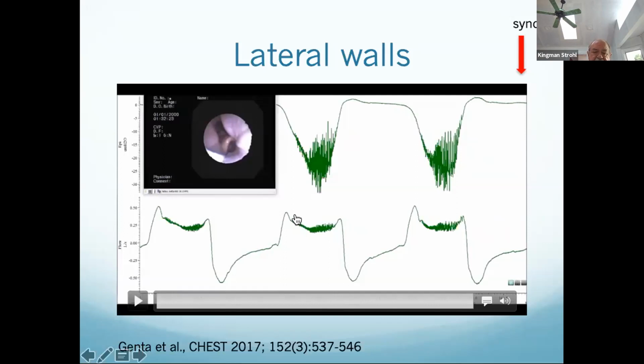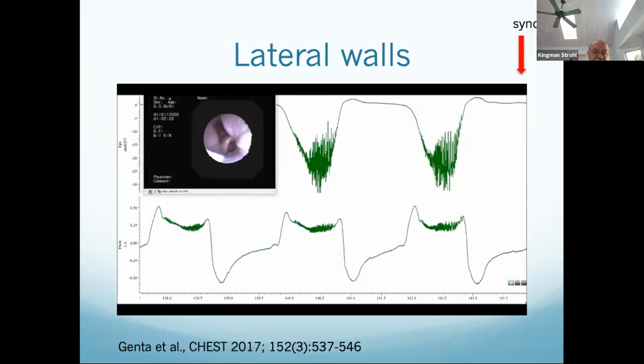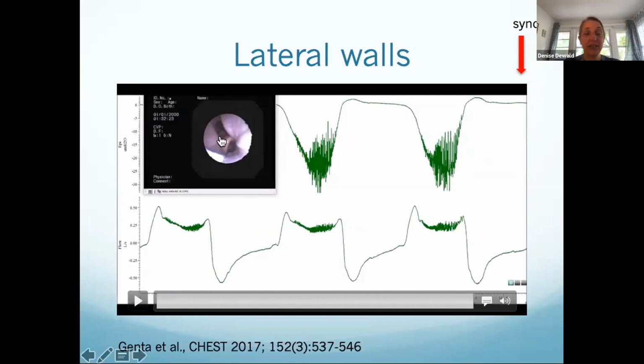The pressure signal they usually use in the nose just has a time constant, so it looks smoother because people don't like it, but that's okay. And so these parts of the airway have high compliance, and that's when you see this good negative effort dependence, or this moderate.